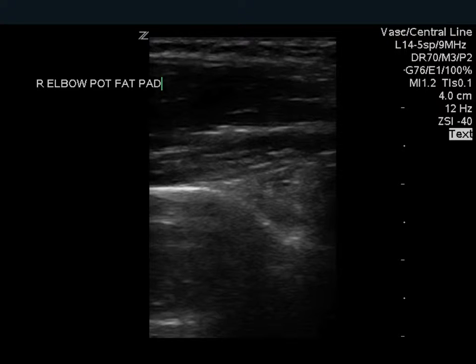If we look at the olecranon fossa and follow its contour, we see that the posterior fat pad is adherent to it. Admittedly, I used to think that it was enough to draw a straight line that continued on from the posterior humeral line and would ensure that the fat pad fell beneath this line. The problem is that if this is your sole criteria, you could get an effusion that is so small that the posterior fat pad isn't adherent to the bone in the olecranon fossa, but not big enough to displace it beyond that line. Therefore, look to see if it's adherent or not.